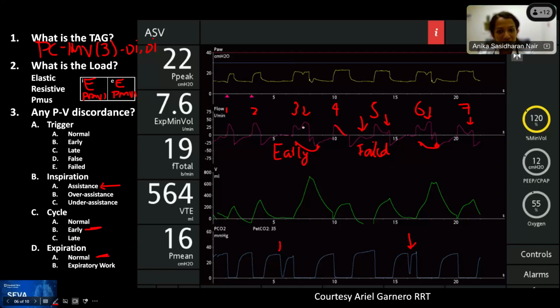One of the additional things on top of seeing the deviations of the waveform is that we can see how different the tidal volumes are based on the presence of PMUS. So we have these 2 spontaneous breaths, and then over here we have our mandatory breath that had a certain tidal volume. Here there was probably a larger PMUS, and we can see that the volume is probably touching close to 800 cc's over there. That's a good illustration of how P vent plus P mus gives you the tidal volume. They add together.